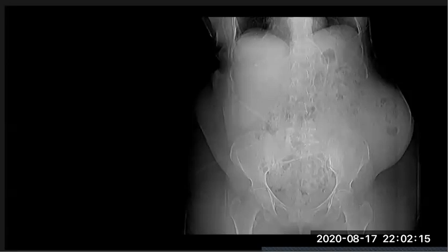This is a scout image, a frontal projection X-ray of the abdomen and pelvis, showing an outbulging involving the left lateral aspect of the abdomen. I think this outbulging contains foci of gas outlined in a bowel fashion. It seems like bowel. So my differential is a hernia containing bowel. I think it is large bowel, but I'm not sure. Which type of hernia do you think here?